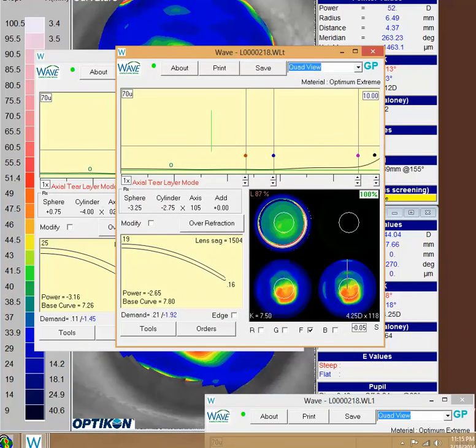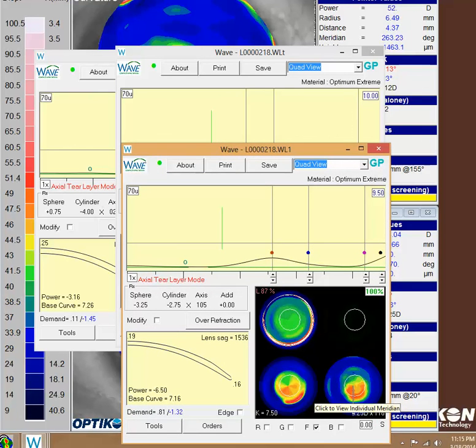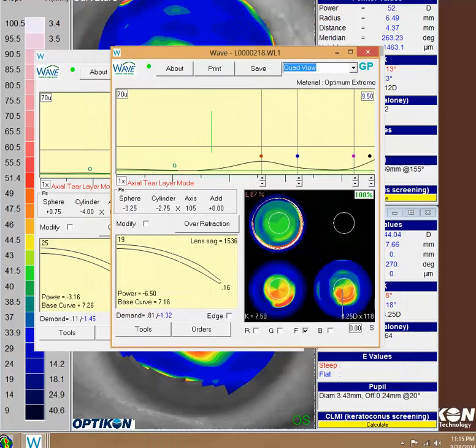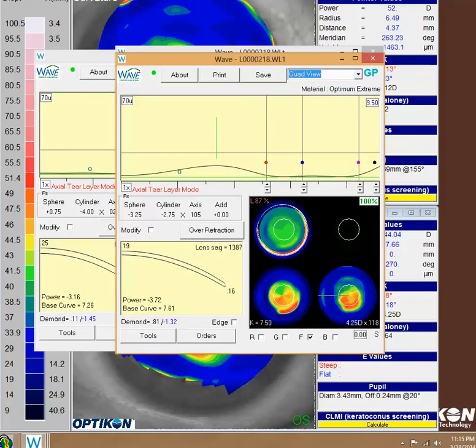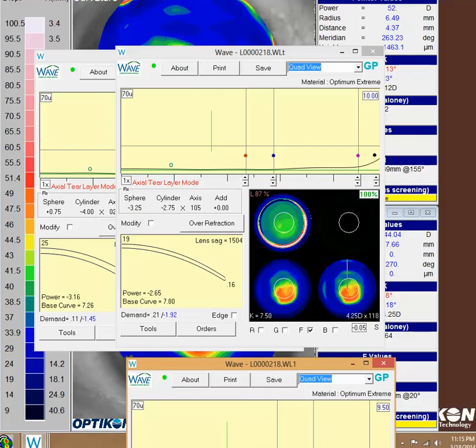The left eye, it looks like you didn't have as much of a frustration with the power. That could also be because this cone is a little bit more decentered. It's not right down the visual axis. But again, what I did in this case, I showed an example. This is your design here, and again, it looks like a really nice design. But what I did is I kept it in axial and I just added that little aspheric component. You'll see now you've got a back surface that really closely matches that cornea.